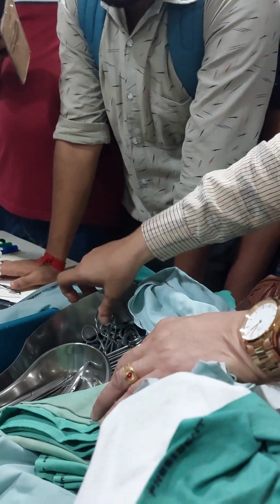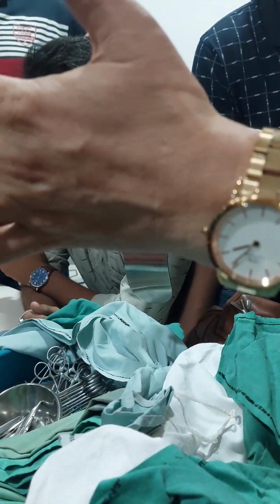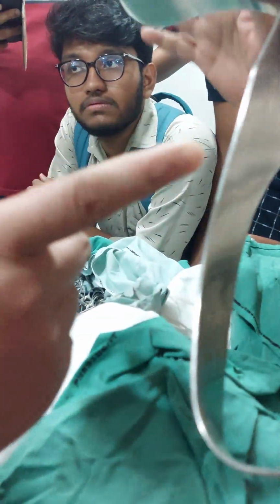Either frontly near the bladder we retract the bladder and push it down, and you can use it posteriorly to push the whole intestine up like that, so that the whole area is totally clearly visible and you can do the surgery.